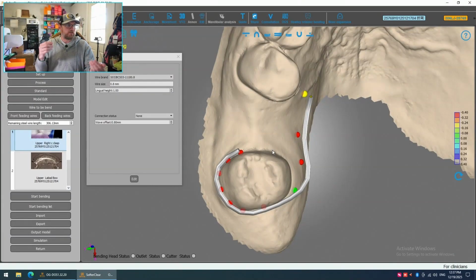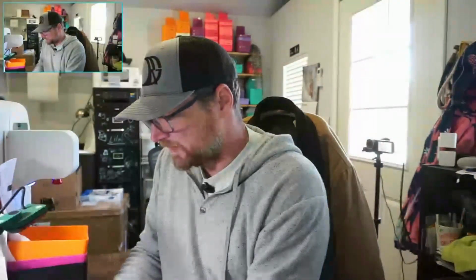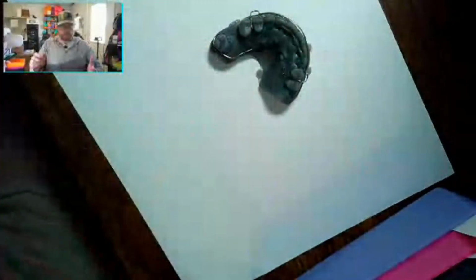Again, I'm still working with JBC wires to try to calibrate it. I'm working with Dr. Neil, and we should get these dialed in really well with the next software update. So far it's been really good. Maybe it's 80% all the way there, and I bet we can get 90 to 95% there. But I think it did pretty good. All right, let's just move on to the next one.